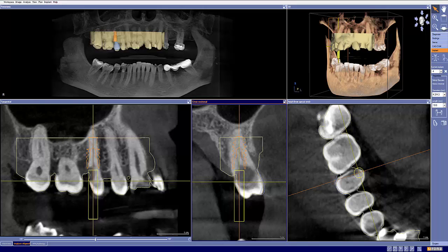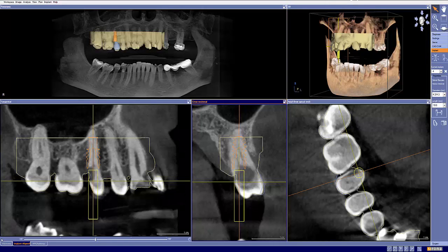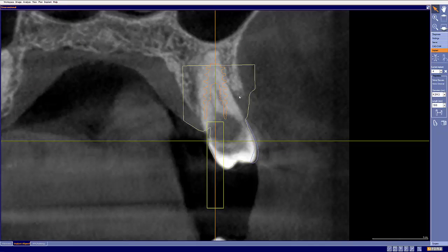But now when we start looking at bone level, that presents a bigger issue for us. I'd like to continue to move along here. In looking at this, one of the things that I see of concern is the bone level position. Here we can see our bone level goes to right here and right here. We know that we're going to lose some, so our implant really needs to be placed almost right there from a bone level perspective.